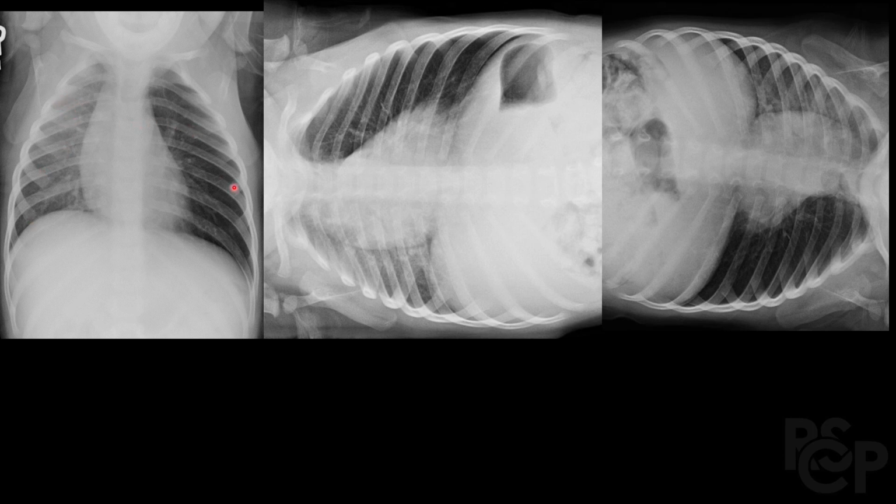So whenever there's asymmetrical inflation of the lungs, obtaining a lateral decubitus view of the chest tends to be the next good step in order to identify a central airway obstruction. So whenever you see this, you should think of a central airway obstruction. And so then they got these two images. This is in the right decubitus view. And what we see here is the right lung partially collapsing because it's down due to gravity and the mediastinum compressing on it. So this is normal.